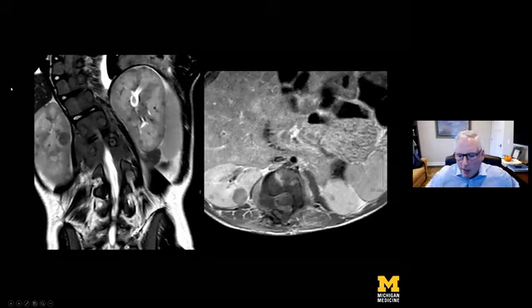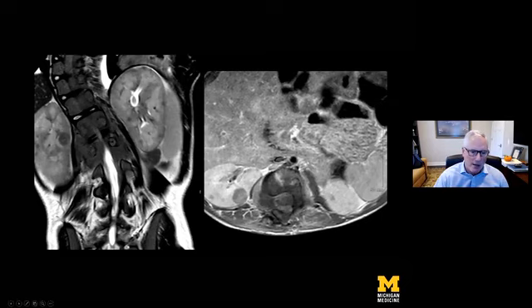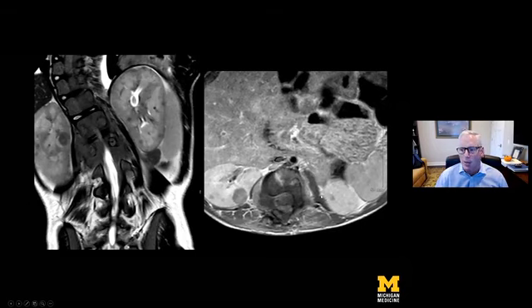And this was a very interesting patient who had had multiple surgeries for scoliosis and had developed what was believed to be osteomyelitis of the hardware and the spine, and had the hardware removed. And you can see postoperative changes as well as abnormal soft tissue. But what we also uncovered at the time were bilateral renal masses when we were doing their spine imaging, which would be very similar to what we would do for abdominal imaging with MRI for tumor. And these bilateral renal masses turned out to be Burkitt lymphoma. So again, lymphoma can give you multiple masses.